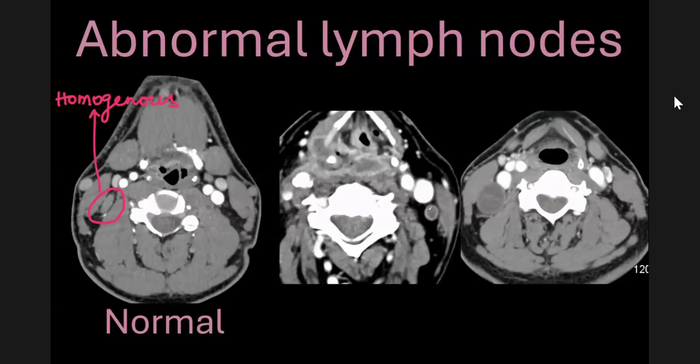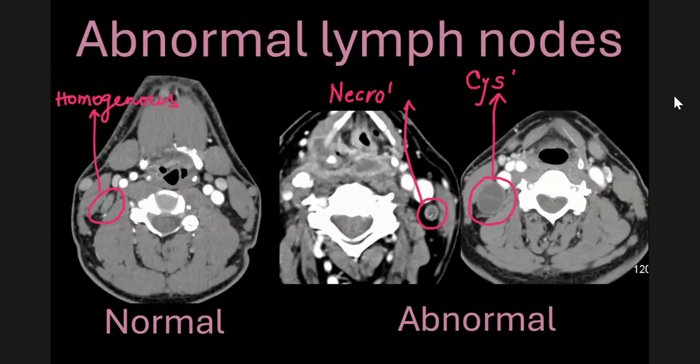They could be necrotic. So necrotic lymph nodes are always abnormal. You can see that this lymph node is not really enlarged. It is still small in shape. It is definitely less than 10 millimeters in the longest dimension, but it is rounded and shows central necrosis. So this lymph node, even though it's small, is definitely abnormal. It's a metastatic lymph node.